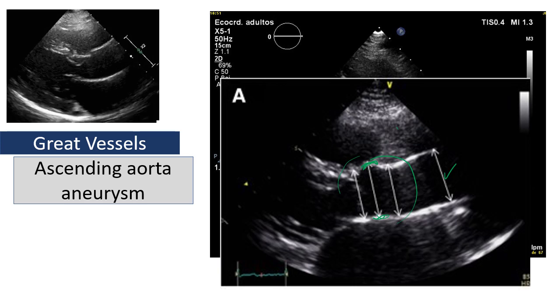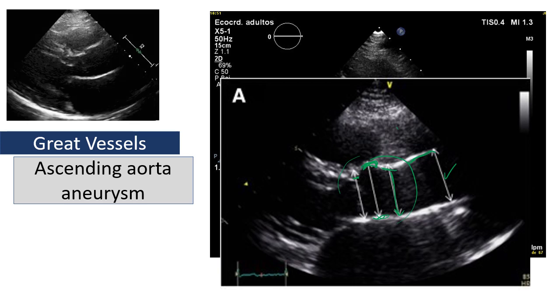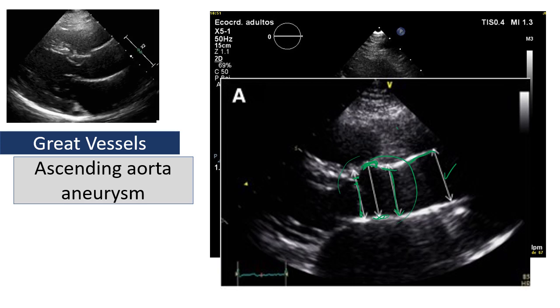This is sinotubular. This is the part that attaches the sinus of the aorta to the tubular ascending aorta, so it's called the sinotubular junction. This is the second measurement. And the third measurement, the only measurement obtained during mid-systole, is the annulus measurement from the site of attachment of both aortic leaflets. So those are basically the three measurements for the aortic root: the aortic annulus during the mid-systole, and the bisinus and the sinotubular junction during the diastole, and also the measurement for the ascending aorta.